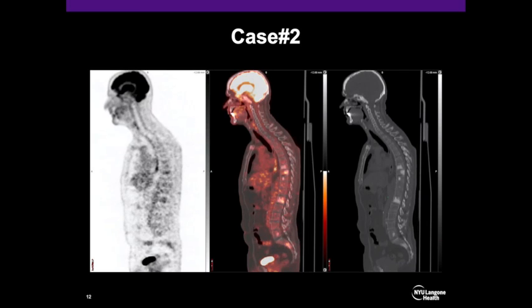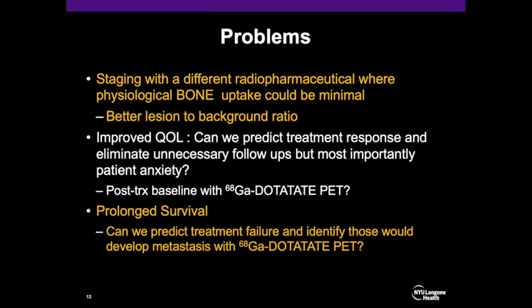However, I think this is convincing for everyone why the patient had low back pain. We are looking at widespread sclerotic metastatic bone disease on this FDG PET-CT of the whole body. And we run into a very similar issue with the brain cortical uptake. Look at the bone background. On PET-only images, it's hard to differentiate what is metastasis and what is physiologic activity of the bone marrow. But when we combine it with CT images, it becomes a more powerful tool regarding which one is metastasis and which one is not.